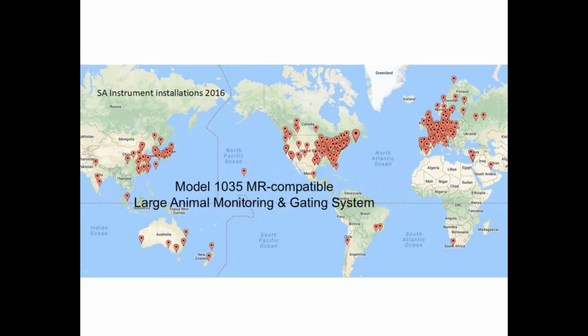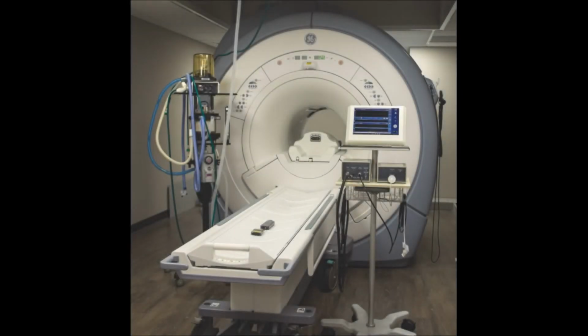In this video, we present an overview of PCLAM software. PCLAM software is the user interface for the Model 1035MR compatible large animal monitoring system. The hardware for the Model 1035 is covered in another video.